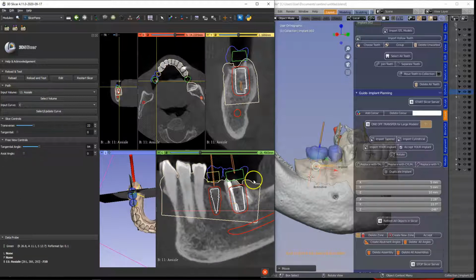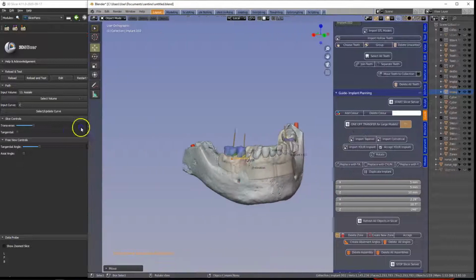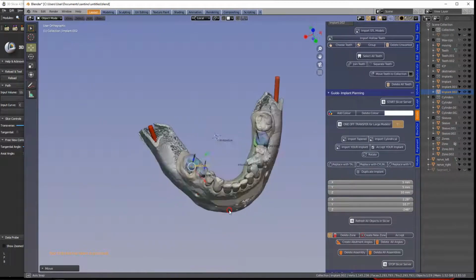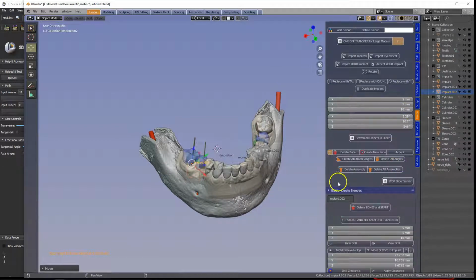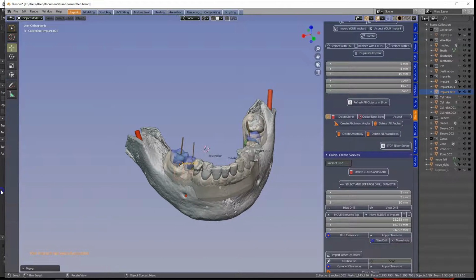Okay, so assuming we've got what we needed, we finish with 3D Slicer. We don't need it anymore. We can now close 3D Slicer off because we've completely finished with this. So stop Slicer, and we will continue making the guide from here on.